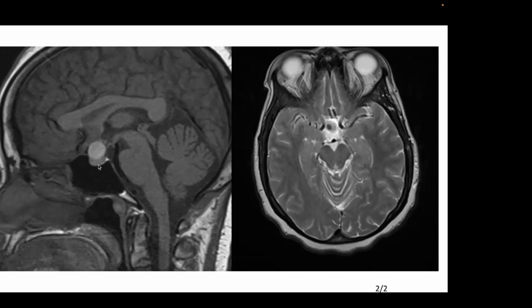So we see the pituitary gland. It's like a bowling ball sitting on top of the pituitary. Pituitary apoplexy is due to hemorrhage into a pituitary tumor. So if the pituitary is normal, this can't be pituitary apoplexy. So now we have this area of short T1 relaxation time. Now you'll notice on the T2 weighted scan, it's inhomogeneous. And it looks like there's something here that's different than this. Does that help you make the diagnosis here? Rathke's cyst. Excellent.